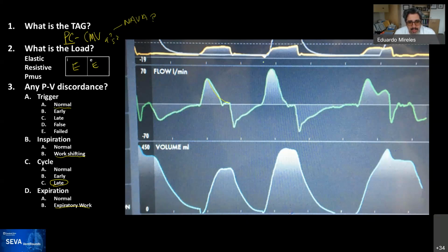Actually, you can see the drop in pressure for the breath. There's none here. There's none here. There's no change. There's no change. So this makes me think that this is a passive breath, and makes me consistent with elastic load, as you read it. And the return back to baseline seems relatively fast for all of the breaths. So I will live with that.